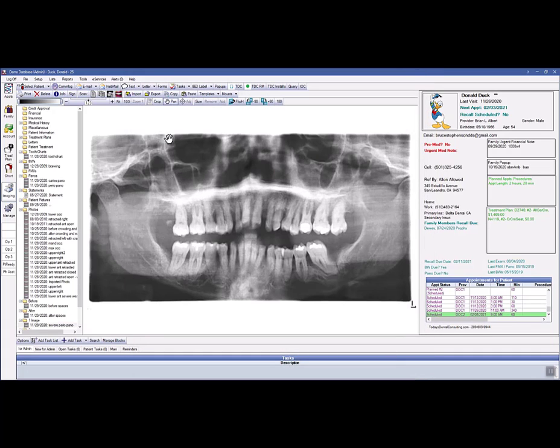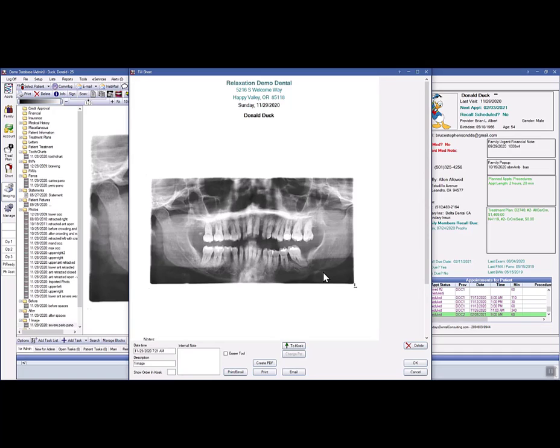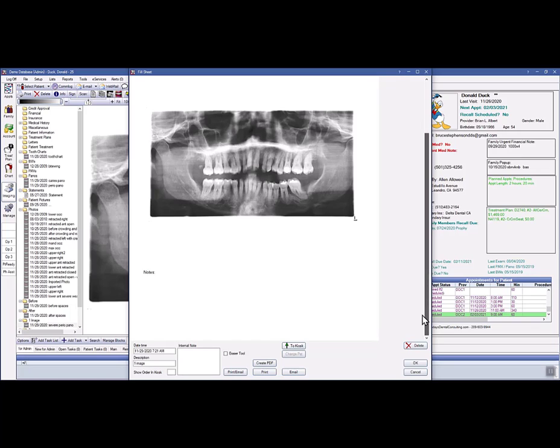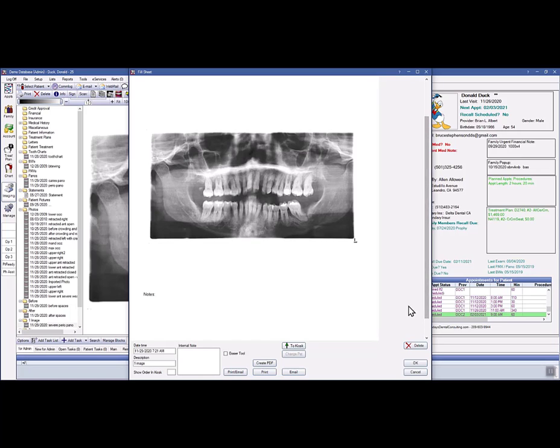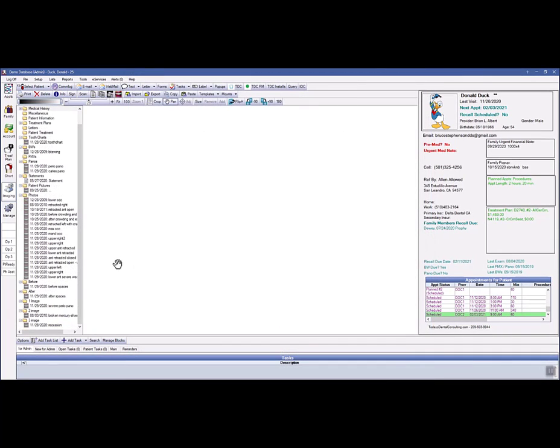If you want to, you could just use that one image. Remember, that was in the image 1 category. So if I just click on this guy, now I just have 1 image in there instead of 3. I also have another letter that has just 2 images. So whatever images you want to show up, you just drag them down to the appropriate category on the bottom, and that's what you get.